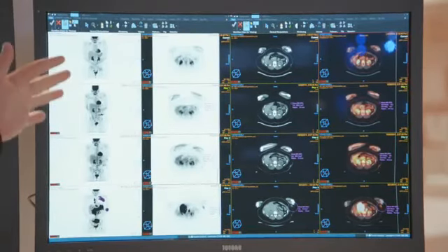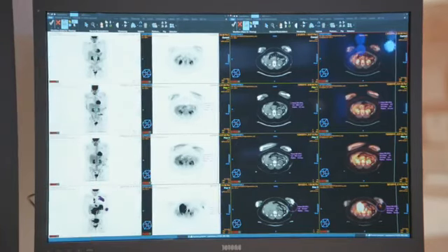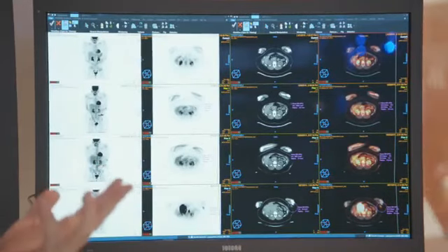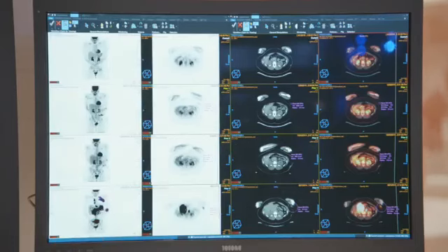So the patient has 3 priors and a current study, and during oncology reading, most of the time what we'd like to do is to do 2 things. We'd like to track new lesions, to find them, and we'd like to track lesions over time to see their progression.